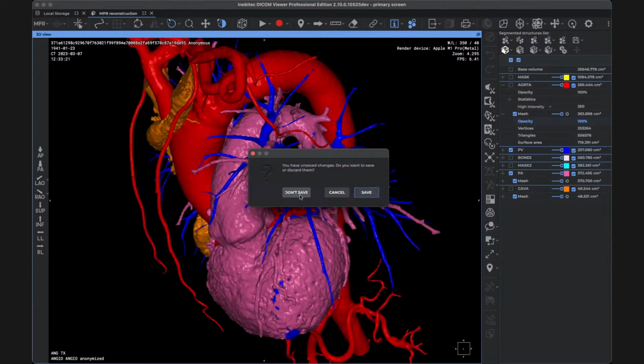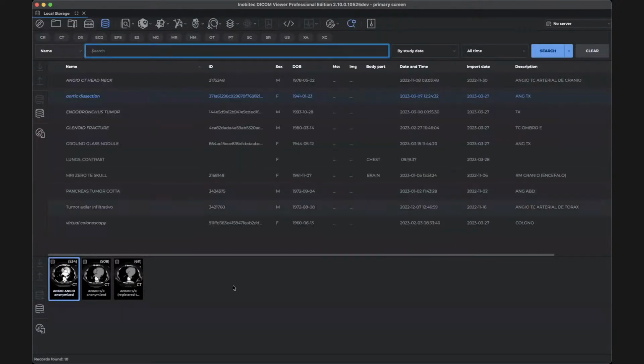So our last case is a very time-consuming case. I recorded all the process, so I could speed up some parts so it would not be too lengthy for the live.